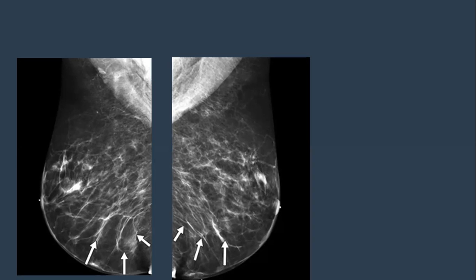So why the skin here? It looks like an irregular skin, both sides. It's not a smooth skin. Look for the skin here, straight and smooth. Yes, there is mild asymmetrical thickening. But here, look for the skin. It looks wavy, bilateral wavy.